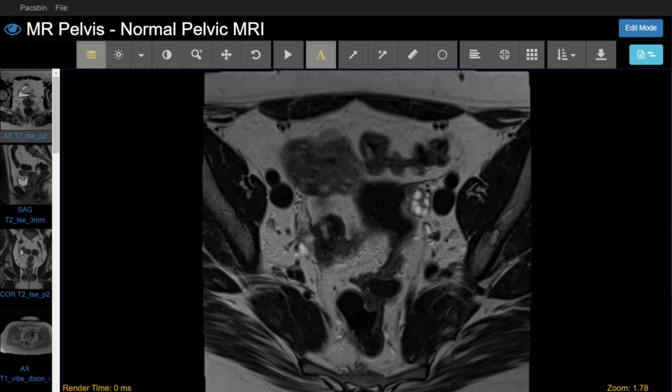So first is to follow the ovarian vessels in the suspensory ligament. So here they are here on T2 weighted imaging, and they go directly into the ovary inferiorly here. They're probably more easily identifiable on the post-gadolinium images. So here we have the ovarian vasculature, the artery obviously arising directly from the aorta. If I follow that down, it dives directly into the normal right ovary.